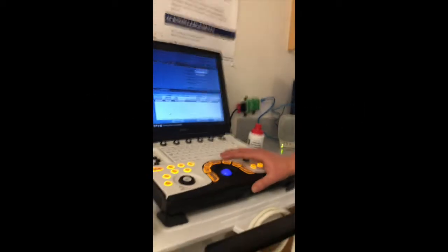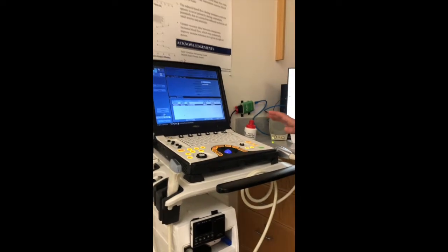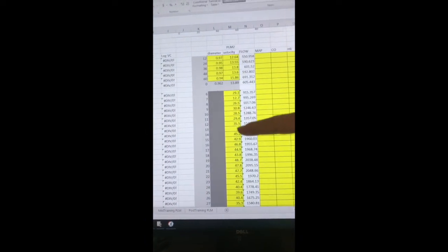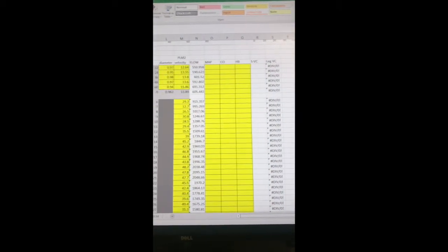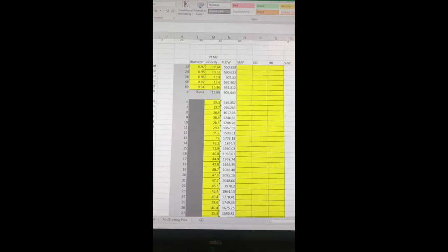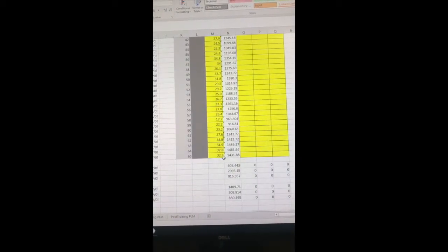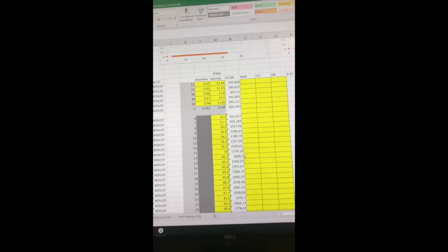Alright folks, we are going to do the PLM 1 second average, which, if you look on any of these graphs, is going to be this section underneath. I think that this one doesn't have any labels. Okay, that's okay. But from 6 seconds all the way down to 65 seconds, this part is going to be 1 second averages of just the blood velocity.